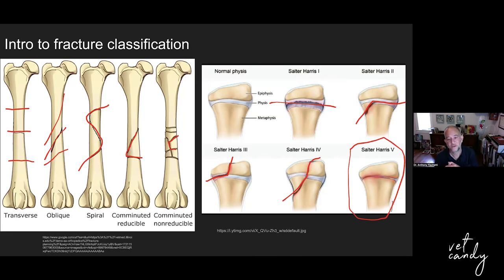If I'm presented with trauma to the long bone in a puppy and I don't see a fracture, I will often say, hey, you know what? It probably would be prudent for us to just check back in 2 weeks and repeat radiographs just to help us evaluate limb growth for further evaluation of these crushing fractures, which can be so frustrating to diagnose. Okay, so yeah, Salter-Harris fractures of the growing physis.